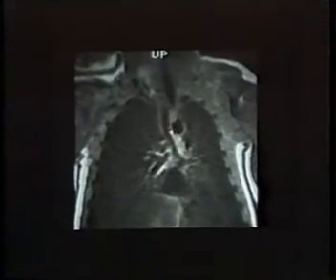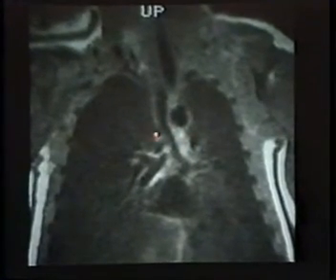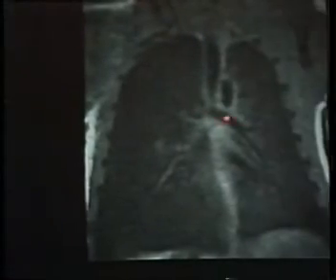In the frontal projection, we have 4 slides. I think there are 3 millimeter interleaved images by Dr. Asani. We're looking here at the inferior vena cava, the right atrium. There's your pulmonary artery. There's your right pulmonary artery. Moving posteriorly, we can identify the tracheobronchial tree, the left bronchus. We can see a little bit of the left pulmonary artery, and then on this image we can see the left pulmonary circling behind the tracheobronchial tree.